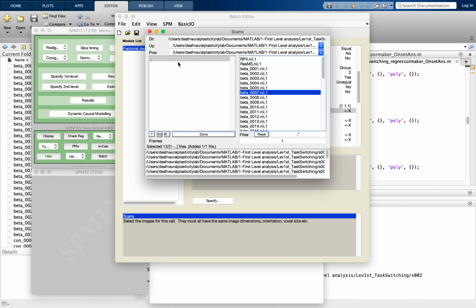Almost done. Yeah, this can be a bit boring, but it's very important that you do well and you don't make mistakes in this, because if you make mistakes you will mess up the analysis. So just concentrate, even though it's a bit boring.